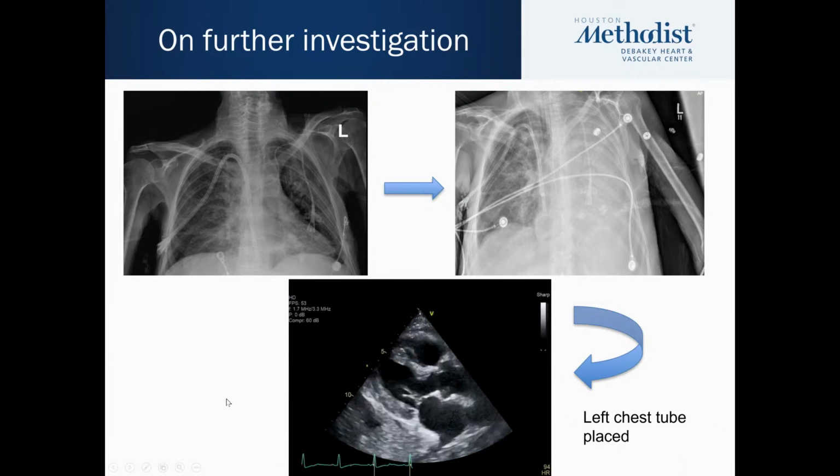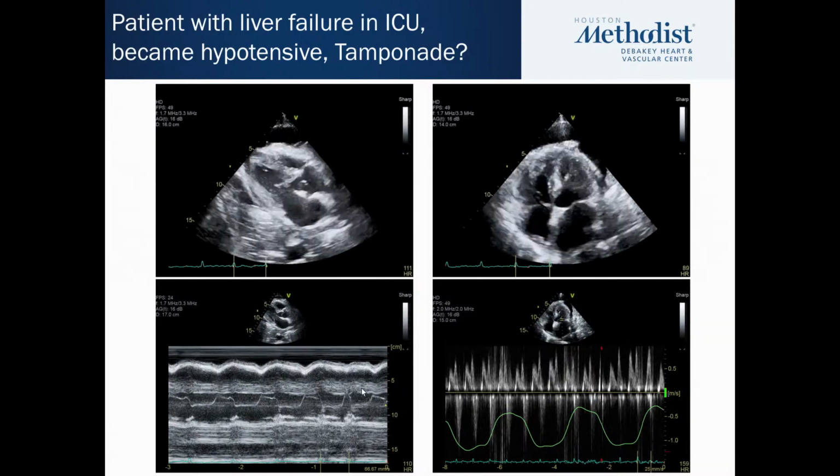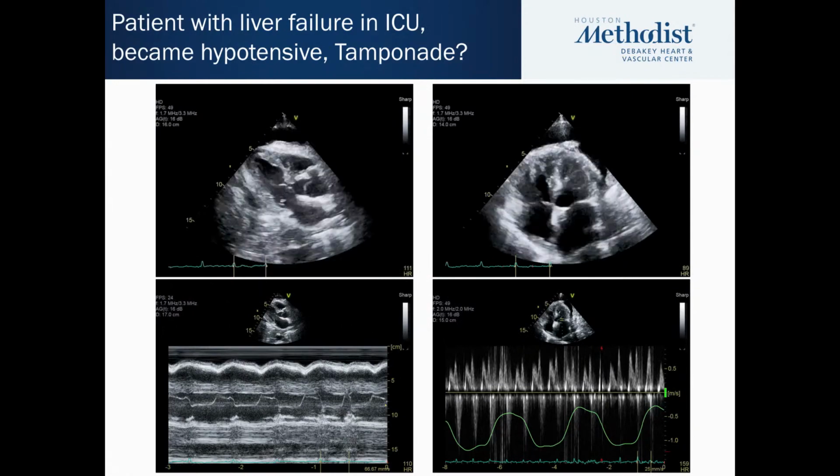pericardial effusion. So going back to the previous echo, you have to pay attention to where the fluid tracks, and this is an extreme case where the large left pleural effusion tracked all the way anteriorly, and this is a good lesson to know that large left pleural effusions can cause hemodynamic features of tamponade, and this was described as early as the 90s.